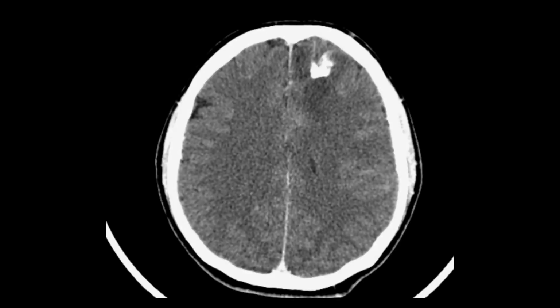Here is another example of the oligodendroglioma. It happens to be a very well-defined hypodense lesion involving the frontal lobe with dense calcification within it, and it is involving the cortical part. In a few cases you may be able to see hemorrhage. It is not that infiltrative as the diffuse astrocytoma happens to be. So this is what the oligodendroglioma will look like on CT images.